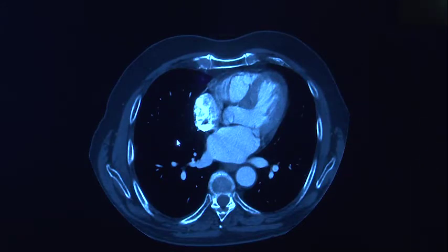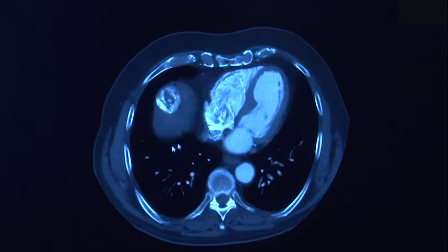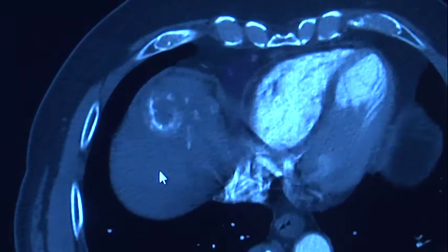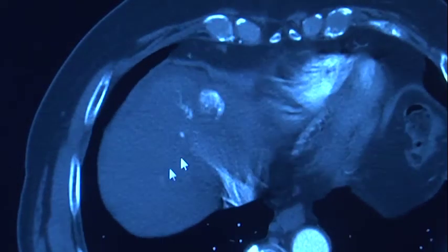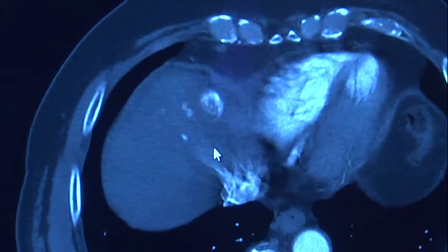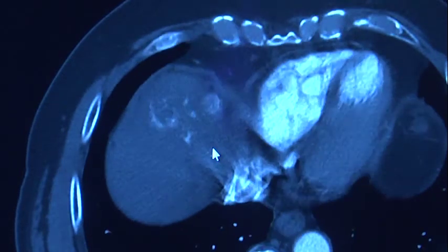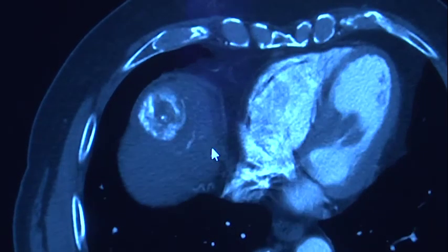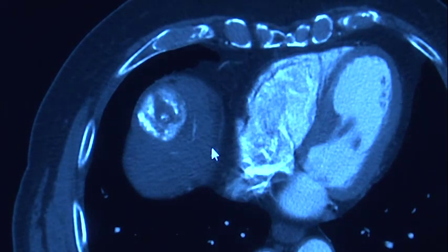We then give the patient contrast and repeat the study. And so these images, should there be any live tumor, would have areas that enhanced or were white in addition to what was seen on the former sequence. And so this tells us that we've effectively killed that tumor area and there's no further regrowth.